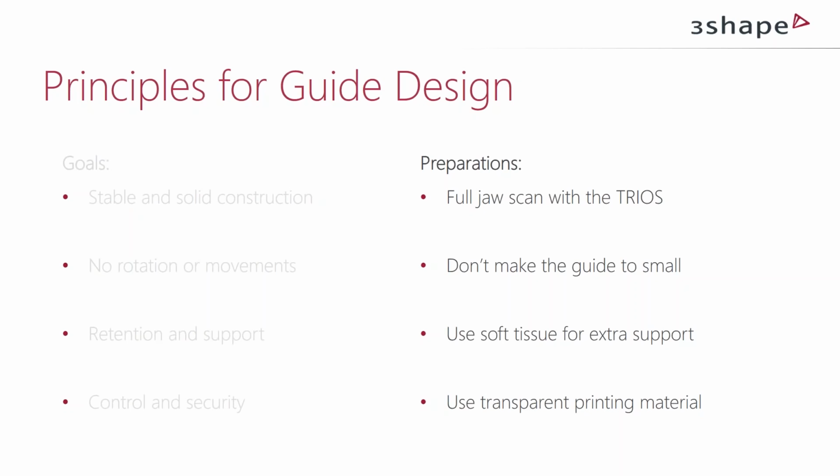If I may also say one thing, transparent materials are not only available for printers, but also are available for milling. We do have some limited milling support already in 2016, and more will come in the future by next year. So again, if you're going to consider milling as your preferred choice to produce guides, please again use transparent material for the said benefits of it: it's just more visual on what is going on and what to consider or how to respond when doing the actual surgery. Yeah, that's good.